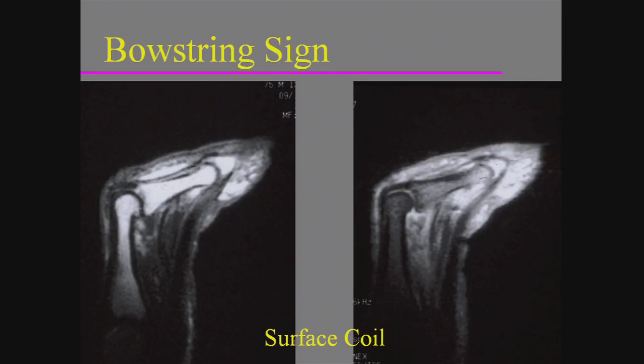These are all patients that I've seen over the last 20 years. Initially, this is a rock climber with a pulley injury, and 20 years ago all we had were larger surface coils, and the way that I would diagnose these pulley injuries is this bowstringing, this secondary sign. Notice the flexor tendon apparatus in the sagittal plane is not contacting the volar surface of the phalanges here. So even though I couldn't see the pulley injuries directly, I know they're there just because of this secondary sign.